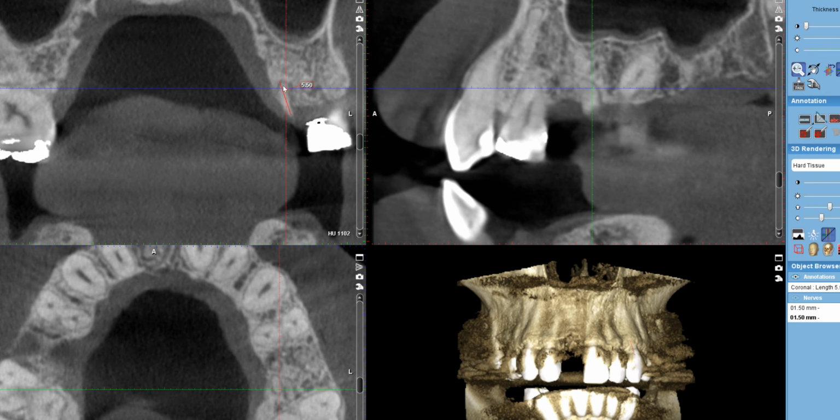But this position is interesting in that it's located palatally within the alveolar process. Remember when we looked at periapical radiograph, I had suggested that this root may have two roots, and the root outline was a little bit interesting, atypical, right? So based on that and seeing what I'm seeing on cone beam CT, it's most likely that this tooth has two roots, just like the buccal and palatal roots of first premolar. So that this person had probably the buccal root entirely removed, and then the palatal root fractured off.